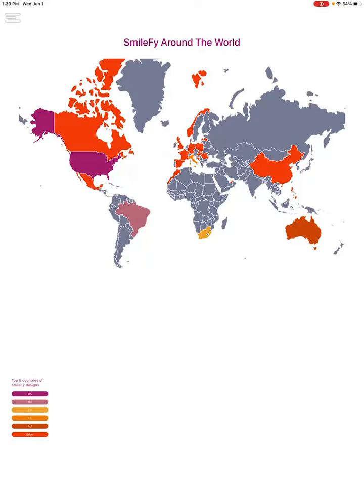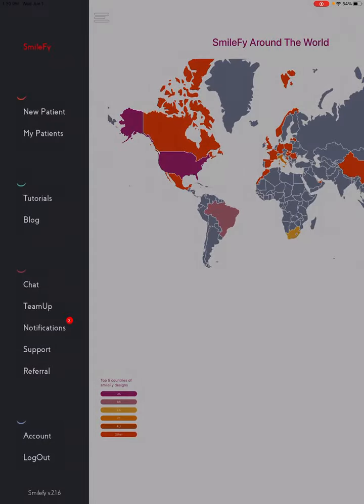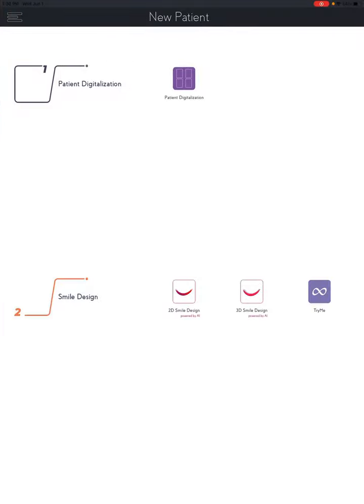Hi, in this video, I'll show you how you can connect your Medit intraoral scanner directly to the SmileFy app. So you're gonna start by clicking on those three bars on the top left of your screen, and then you're gonna select New Patient.